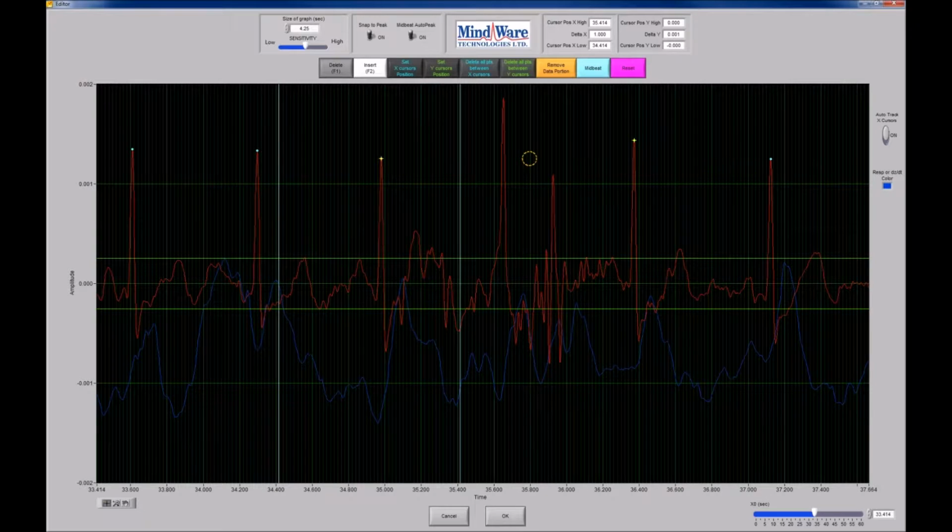So another consideration to make when you're doing impedance analysis, which is different from HRV analysis if you happen to be doing that, is that we don't necessarily care if there's gaps in our data. With HRV, we need this contiguous series of R peaks in order to maintain that consistency and get RSA. But with impedance, all we're really looking for are quality cycles of ECG and DZDT with which to form our ensemble graph. So the fact that there's a missing R peak in here doesn't have any negative impact on your ability to get meaningful statistics from the impedance application.